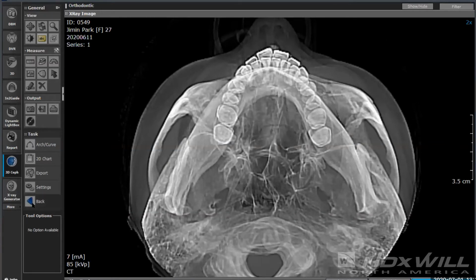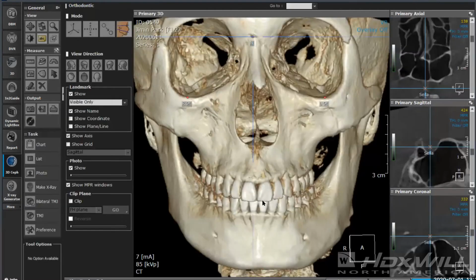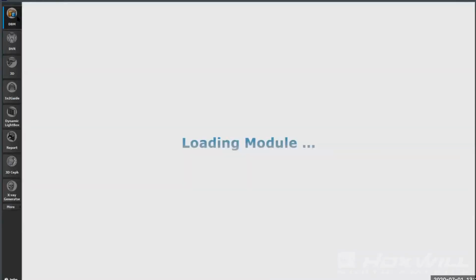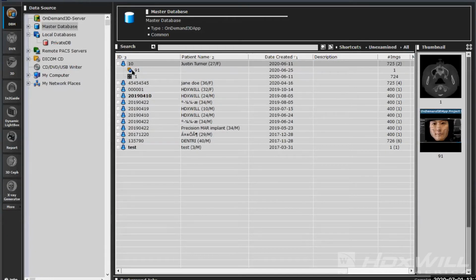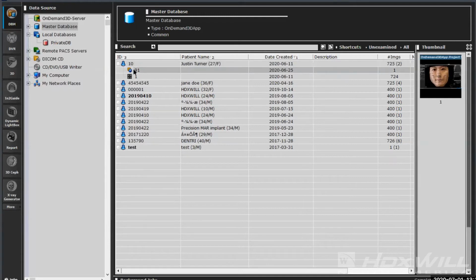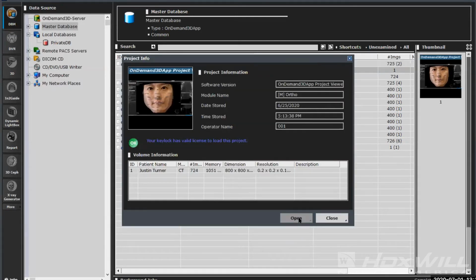So with this in mind, I'm not going to go through all the points, but thankfully my education staff is amazing and they did it for me. And so we're going to look at one that's already got all the points in place.